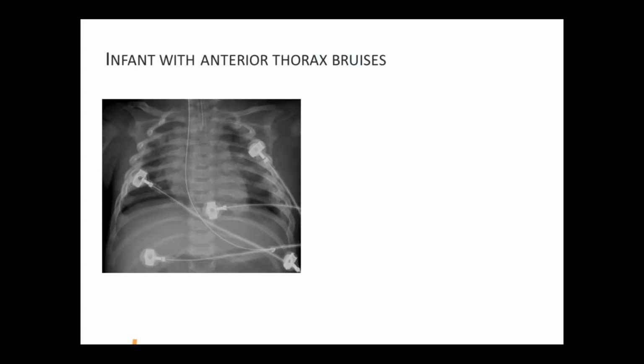Let's now take a closer look at the ribs. What abnormalities do you see, and what is your working diagnosis?